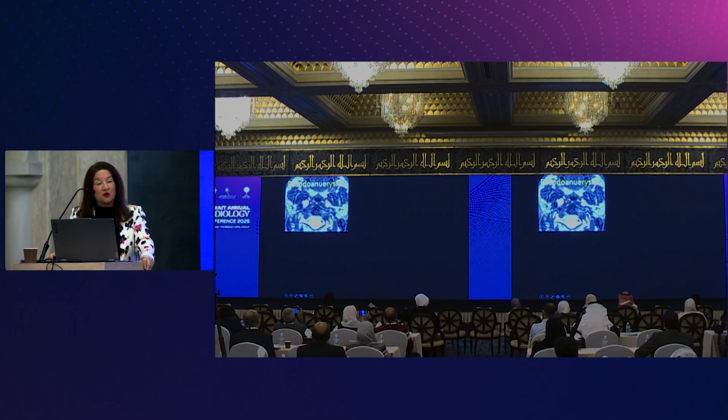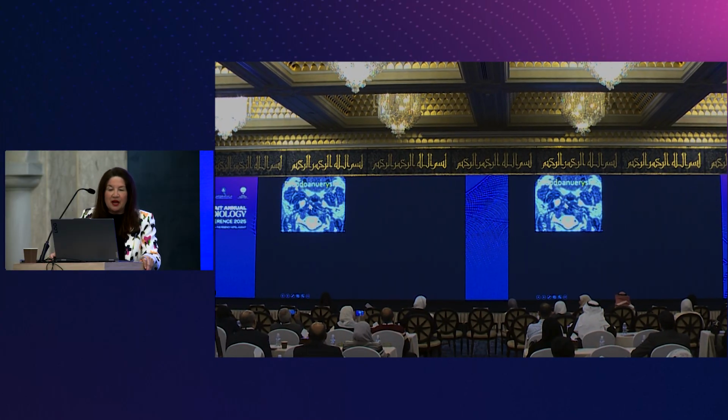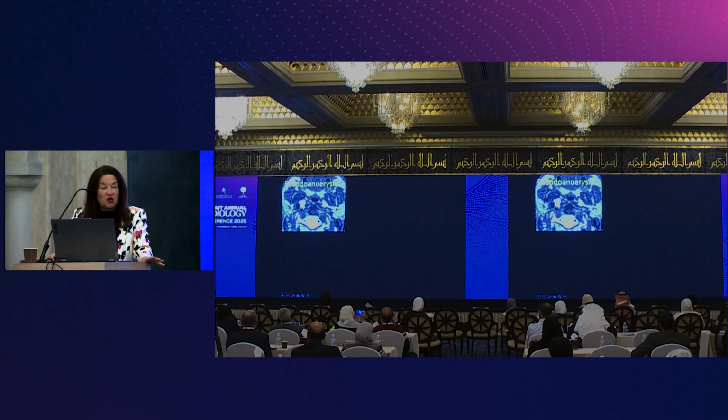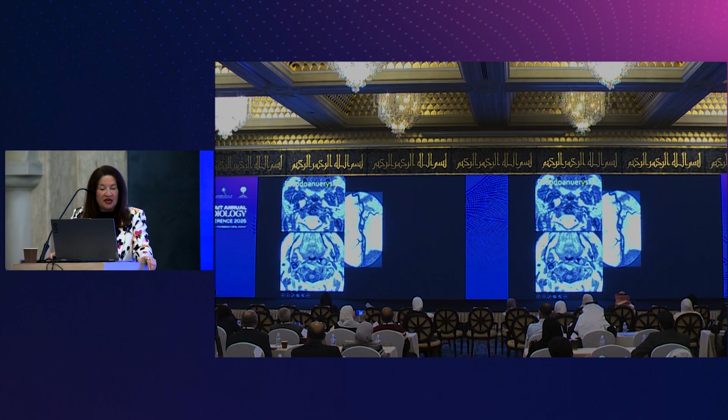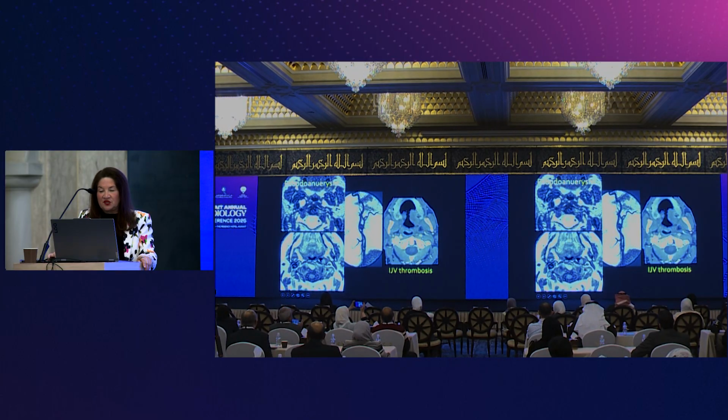These are all cases that were referred to me for biopsy. You definitely don't want to stick this. You'll see a mass here, and the important thing is you're trying to figure out, is this in the pre-styloid space or is this in the carotid space? And I just couldn't find the normal common carotid artery. So this turned out to be a pseudoaneurysm. Here's another pseudoaneurysm. Again, hard to find the normal carotid artery. Always think about pseudoaneurysms. And this is another pseudoaneurysm coming from the carotid space.